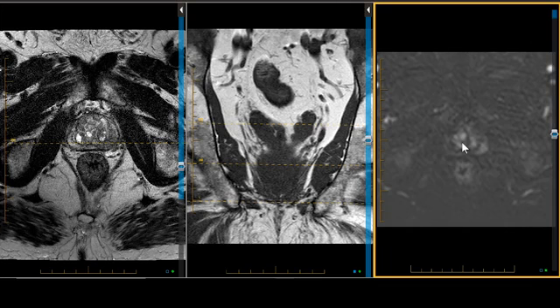So you really can't use dynamic contrast enhanced MR unless you have a big charcoal-like smearing mass with very intense enhancement and very obvious washout. In the periphery, we do see as an isolated phenomenon, first 10 seconds, enhancement in the PZ lateral and PZ posterior.